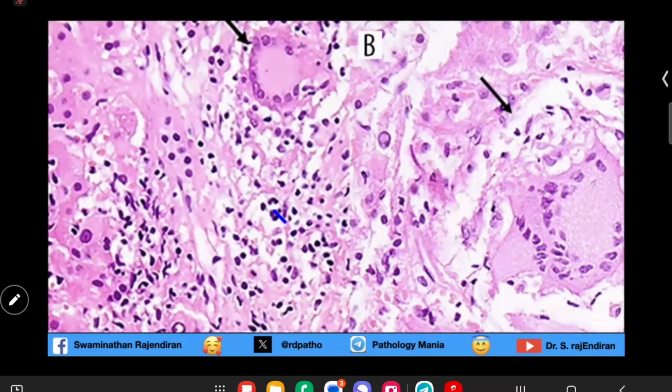And I saw this case, very interesting. These are hepatocytes, and they had granulomas. They are negative for TB, no other lesions. TB is the first one you have to think when you see mild portal inflammation and portal-based granulomas. But this patient never had any history of TB, but there was a history of intravesicular BCG treatment, and they presented it as a case, and I thought it's very interesting. This is the first time I saw it, when I was looking into the literature last week. So this is a BCG granuloma in liver.